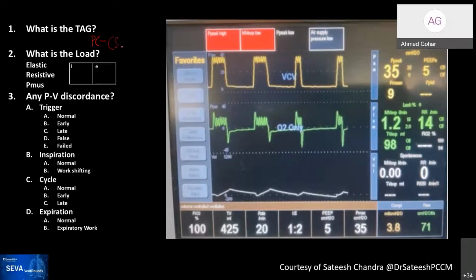But at least the breaths are cycled by the patient because they are of variable length, which would be pretty unusual for a CMV mode to be machine triggered and patient cycled. So I'm going to go with CSV and assume that they are patient triggered, but I just can't see the evidence of the trigger.